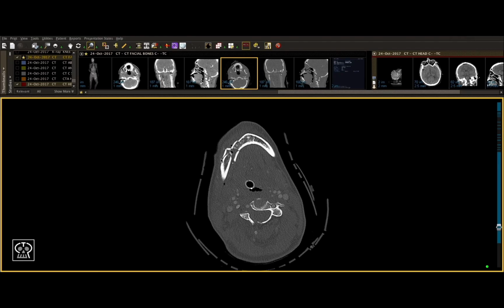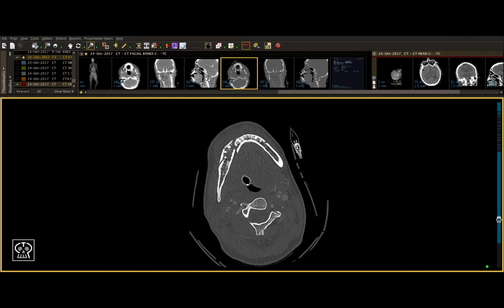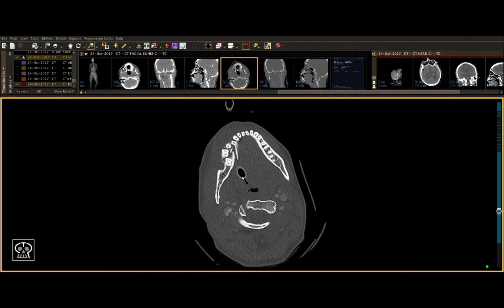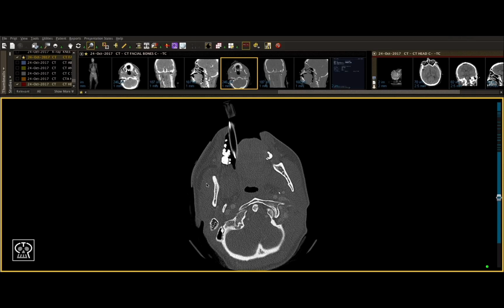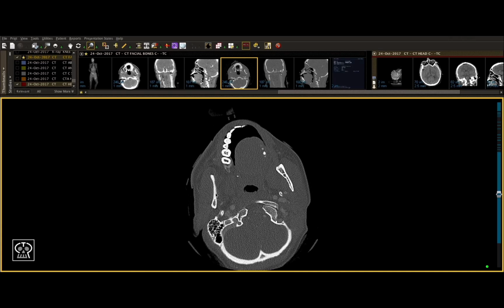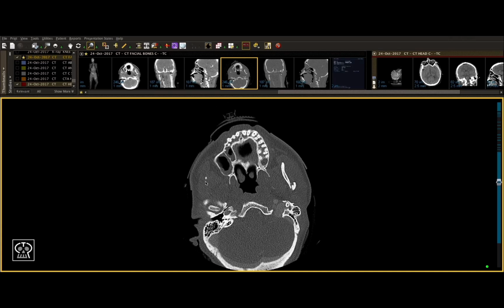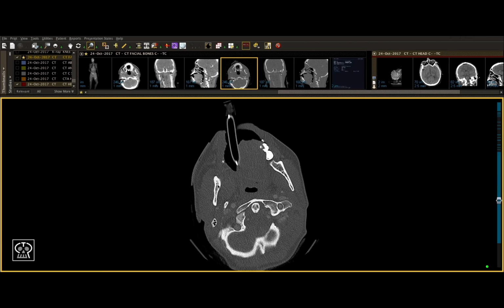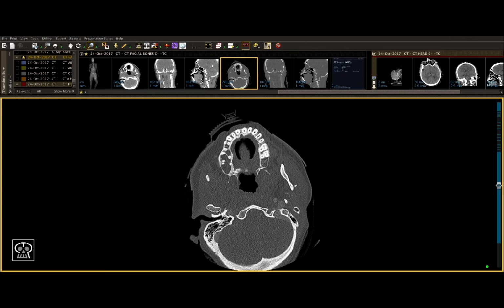After we have analyzed this fracture, we're able to keep scrolling through the mandible, focusing on the right side to see if there's any other fractures present. As we scroll up the ascending ramus towards our sigmoid notch, first we'll examine our coronoid. Then we'll go back down to our sigmoid notch and look at our condylar neck and then the condyle.